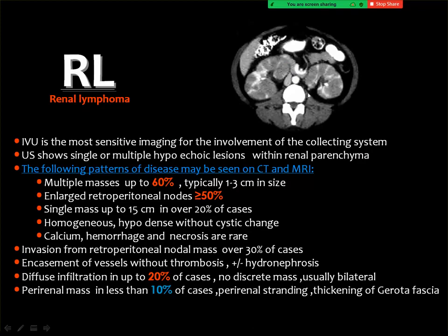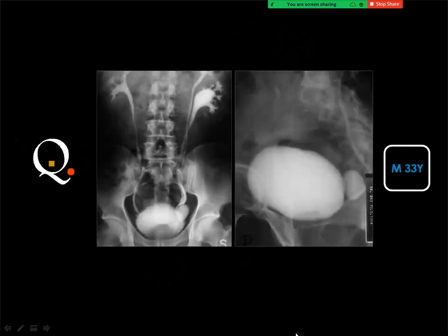This is the usual appearance that we can diagnose easily in clinical practice. The kidneys are swollen, they are infiltrated by multiple solid masses, and these solid masses do not disturb, in many cases, the renal contour. Then you suspect the possibility of lymphoma. Next case.